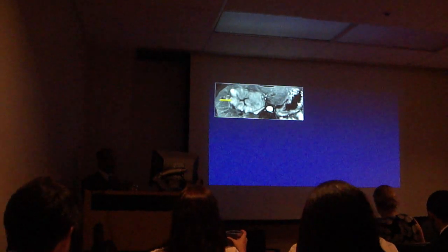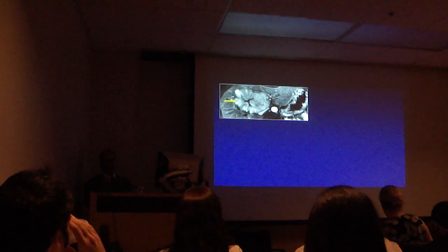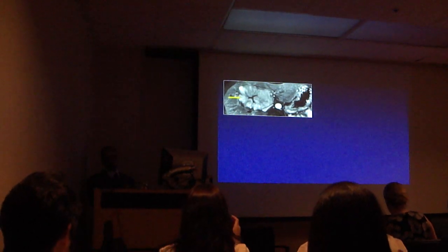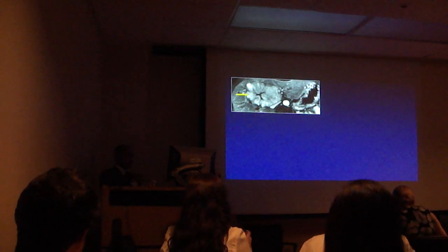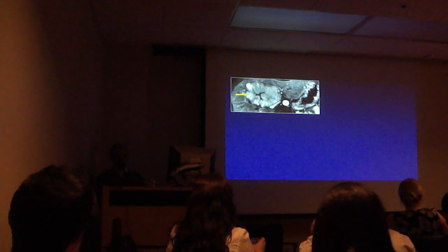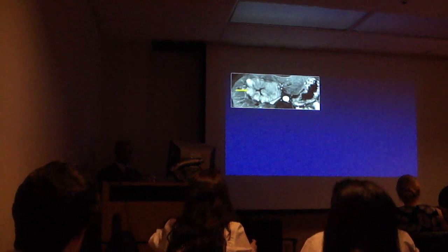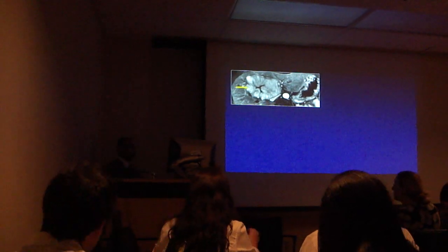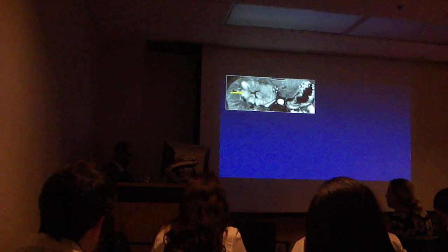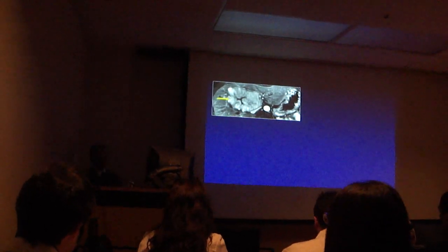Similarly, if a lesion enhances and washes out, remember, washout is worrisome. So the two things that I am going to continuously talk about are margin, whether it is well defined or ill defined, and the other thing is washout. And it's the most worrisome of those two that determines whether a lesion is going to be worrisome or not. So as you said, this is well circumscribed or relatively well circumscribed.